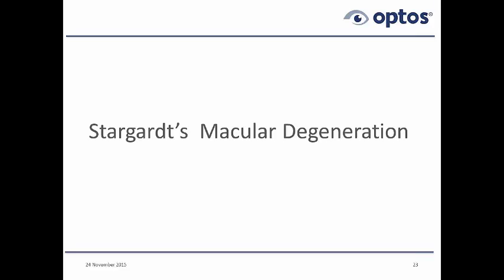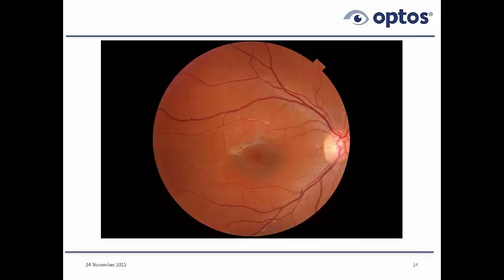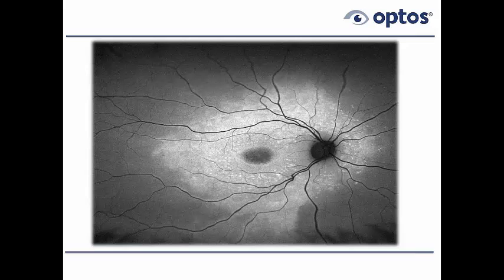Here's a patient who was referred to me by my brother, interestingly enough, seen by lots of different doctors, and mom says 15 over a period of 2 to 3 years, and they all said that everything was normal, the optic nerve was normal, the retina was normal, no cataracts or anything like that, and the loss of vision, which started at 20/30 and went down to 20/200, was actually due to hysteria or malingering for some reason. In any instance, the fundus did look pretty normal. However, with autofluorescence, it was clearly abnormal.